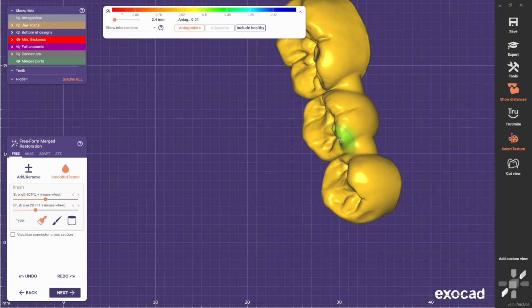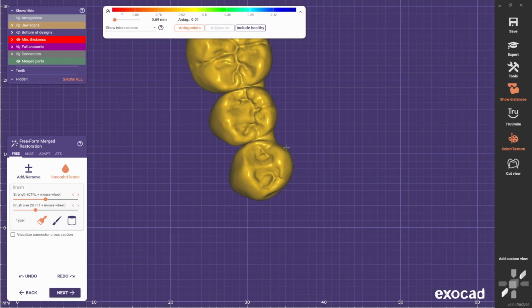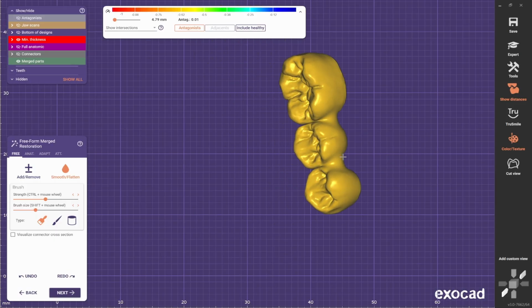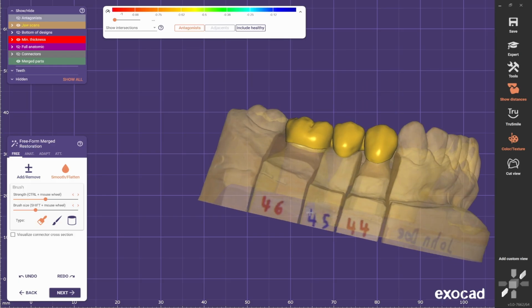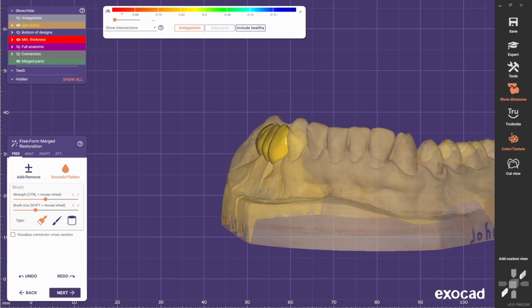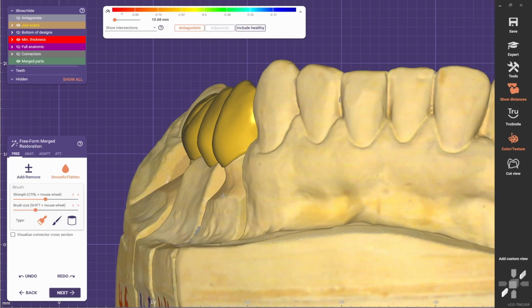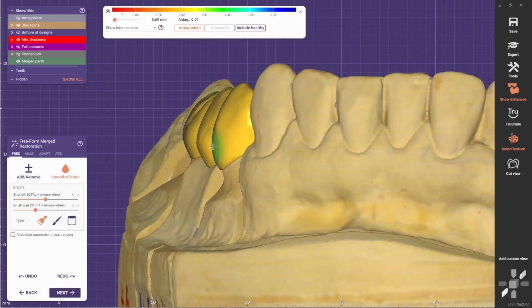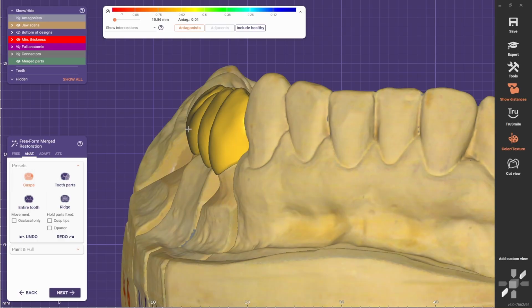So you are able to design it again, and you smooth it out. Something like this. You can always modify something if you don't like it, so probably they are sticking out a bit too much on the belly, so we push them in a bit like this. You can always use tooth parts and bring it inside or outside.